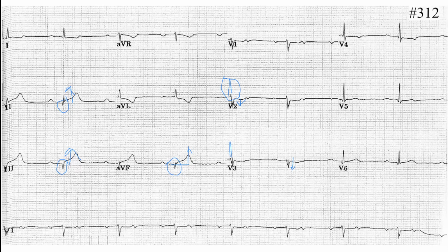Yes. So this is what we say: the 2-to-1 AV block and an acute inferior or inferior posterior STEMI. That's it. But you would not say posterior because you can't really see that. Well, if you do see this ST depression, you can mention it. You won't cause any problem. If you are not recognizing something, that could be a problem. If you recognize more, that's not a problem.